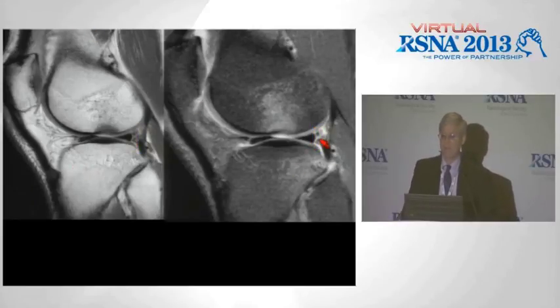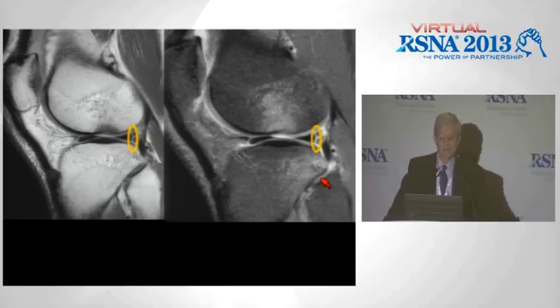And what we really need to look at is that vertical line extending from top to bottom, so it's touching the free edges. Notice there is meniscal tissue behind there. And there's our popliteus, and there's our sheath. So that's what you need to look for. Those are also potentially, they may heal on their own, because that is the red zone of the meniscus. So that's what we need to look for. These are commonly associated with ACL tears. Does this person have an ACL tear? Absolutely. You have the pivot shift contusion pattern.